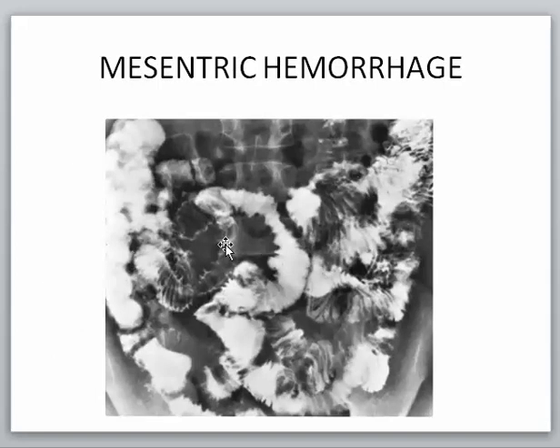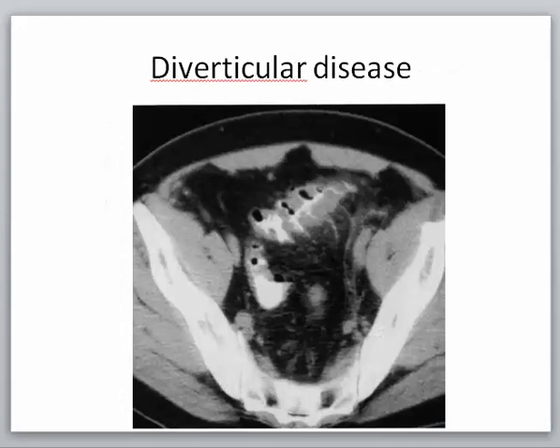So mesenteric hemorrhage, mesenteric ischemia, and subserosal deposits are all indentations from outside or from the submucosa. This one is showing air outside a narrow lumen. There is a narrow lumen here, and this narrow lumen is showing serrations, and this air is filling some of these serrations.